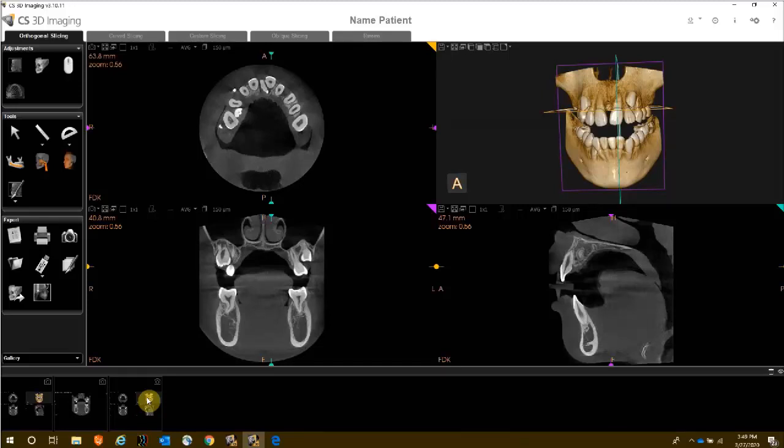If you have a need to take a screenshot of a particular window, you will notice there are icons above each one of these pictures. The very first icon looks like a floppy disk, and has a drop-down arrow next to it. When you click on that drop-down arrow, you're presented with a camera icon as well. By clicking on that camera icon, you are taking a screenshot of just that one particular window.